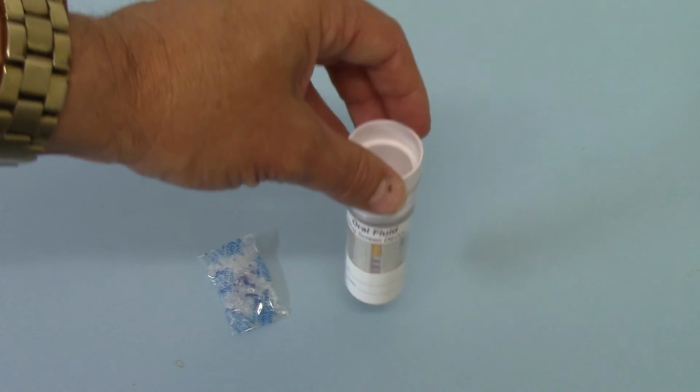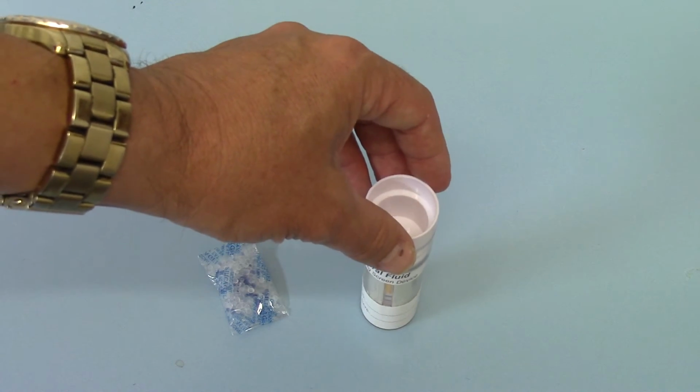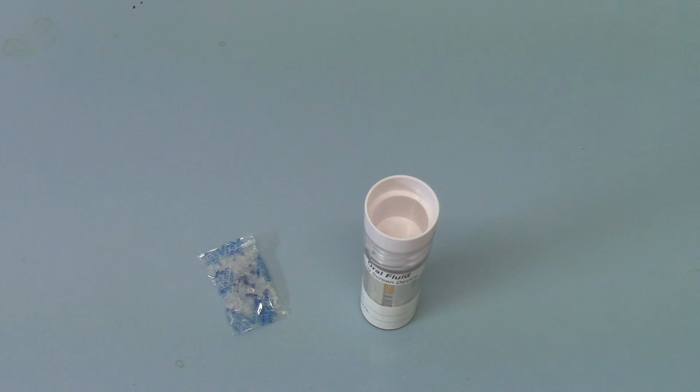Okay, so that's the WHPM 6-in-1 saliva testing kit. Very nice, easy and accurate test to do. Great thing about this is the chain of custody issues are completely overcome by being able to conduct your sample collection directly in front of both examiners without any potential for the sample to be adulterated or substituted.